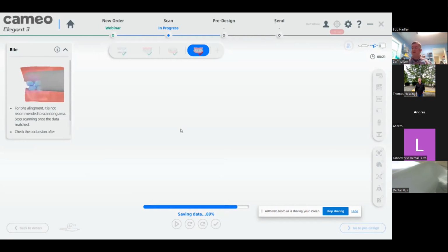And so it's going to calculate the data, and then we'll show how to send it. And then I'm going to show a couple of simple things on how you calibrate it. It's very simple. And then I'll take any questions if you have any.